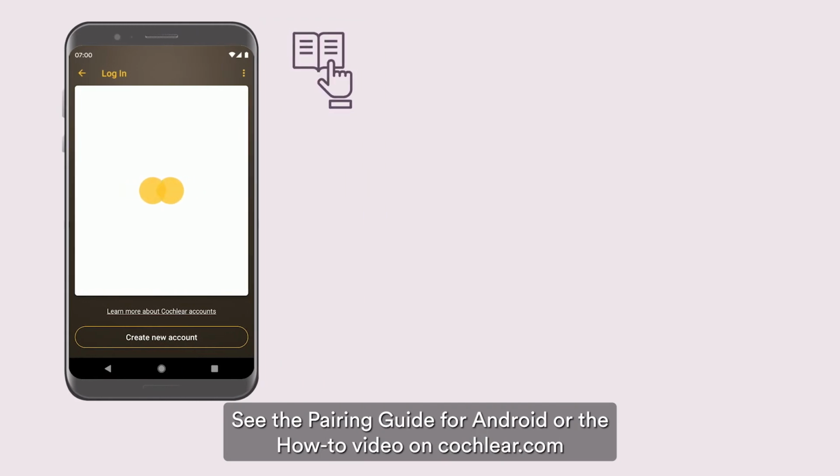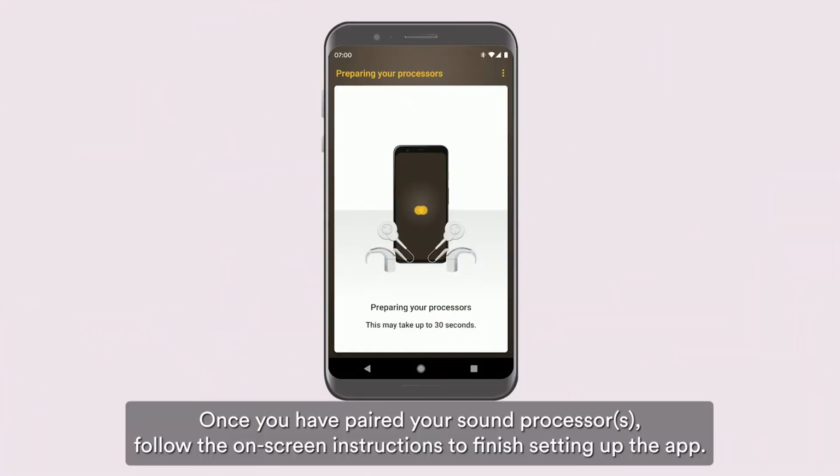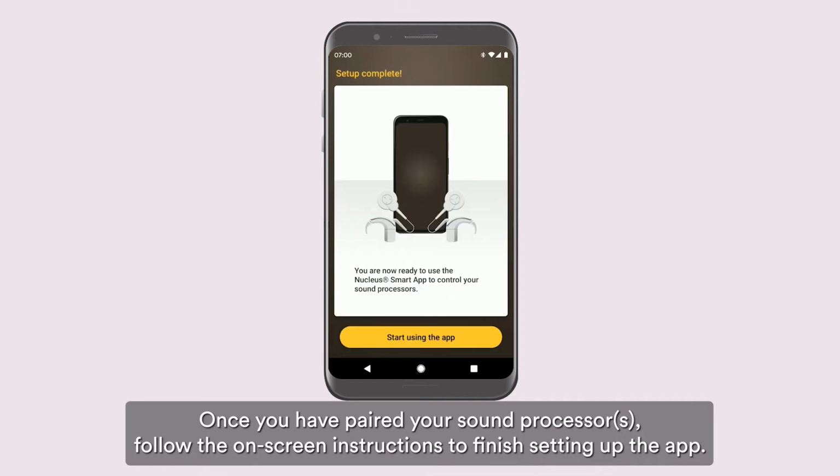See the pairing guide for Android or the how-to video on Cochlear.com. Once you have paired your sound processor, follow the on-screen instructions to finish setting up the app.